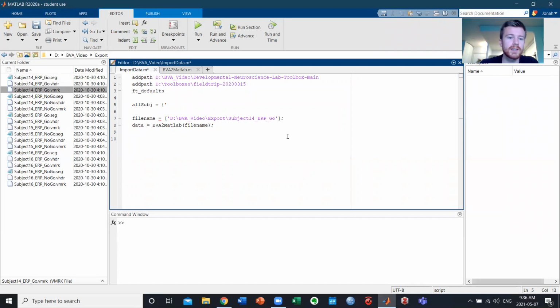So I'm going to create this in a cell array with the curly brackets because it's going to be all text. So I'm going to put, well, I could do actually just a regular one, but it's okay. All subs, there is 14, 15, and 16. So I've only got 3 subjects here, so it doesn't take me too long.